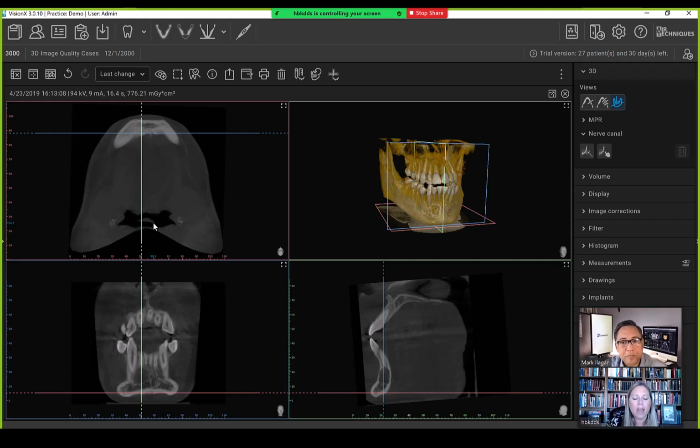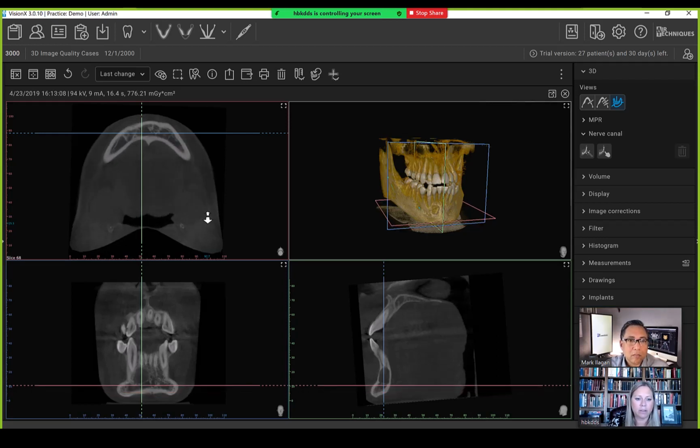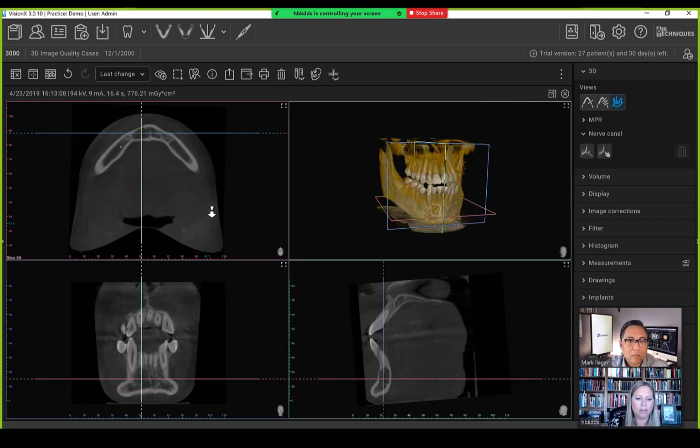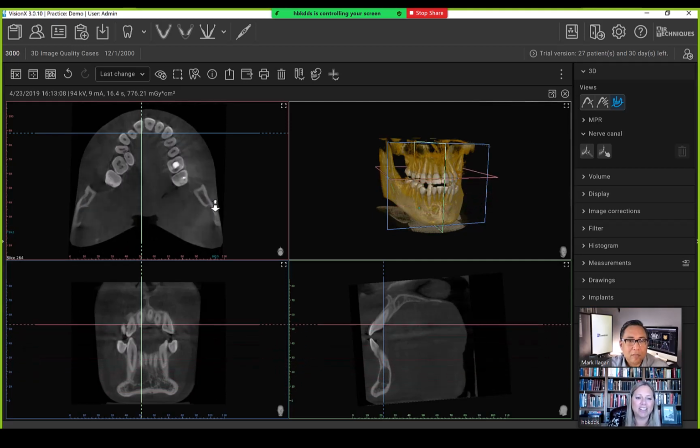And this tends to be the level that we see calcified carotid atheromas at. So I'm going to look posterior and lateral to the airway space. They typically are going to be out in this area, and they're going to have an arcuate appearance. These little calcifications will, because they're rimming the artery. But we don't see that with this case at all. So this looks great. I'm going to go all the way up through the airway space, making sure that everything looks pretty nice.